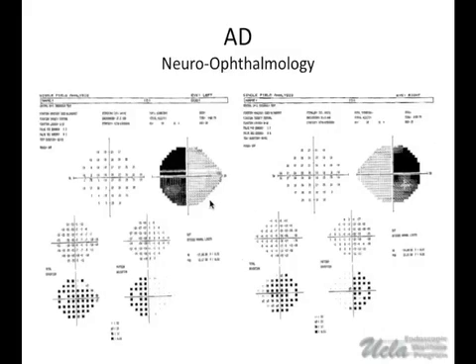What you see on these visual fields are, as our arbitrary look goes, set up so that you're looking as if the patient's looking out from his eyes. This one on the right here is sort of an irregular arrow. On the right is the right eye, temporal, nasal, and the left eye, temporal, nasal. And these obviously have dense bitemporal visual field cuts that run right down the midline.